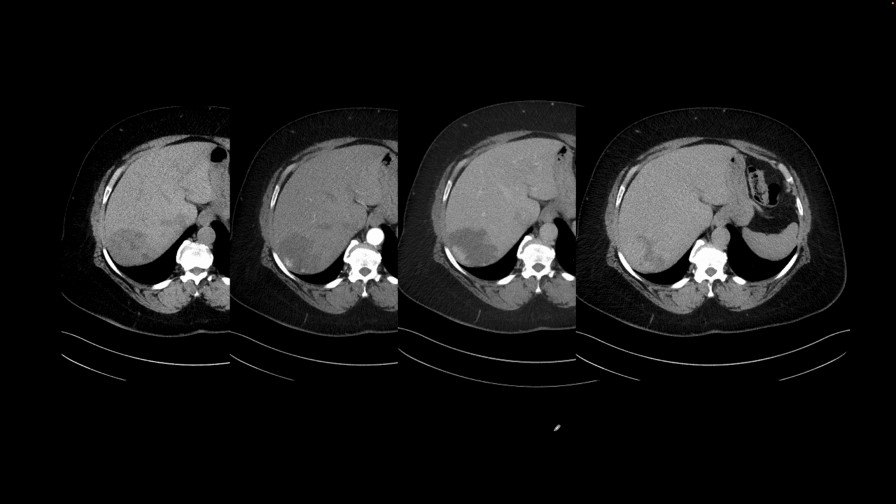Here is our next patient. We have performed a multiphasic CT to evaluate a tumor in the liver: non-con, arterial phase, portal venous, and delayed. We see this hypodensity which fills up partially peripherally, and so the characteristic appearance is discontinuous peripheral nodular enhancement, and there is centripetal filling, so from outside to inside it will fill up.